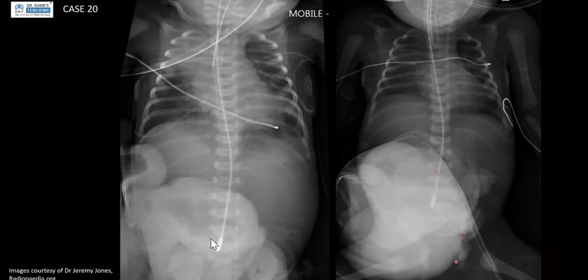This is a frontal radiograph of a neonate. I can see multiple lines. There are some lateral cardiac lines, which are at the left apex and also at the right parasternal area. And then 1 line at the midline, from the cervical spine down to the lumbar spine. I am not very sure what line this is.